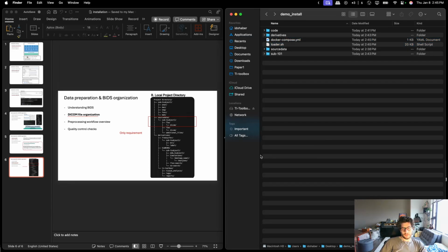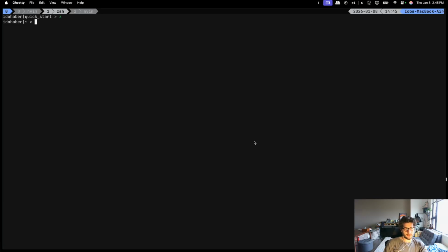So we will go to the terminal, and we need to go to where those are. So I'll go to Users, user, Desktop, and then what do you call it, demo. Oh, wait, found it. Great.